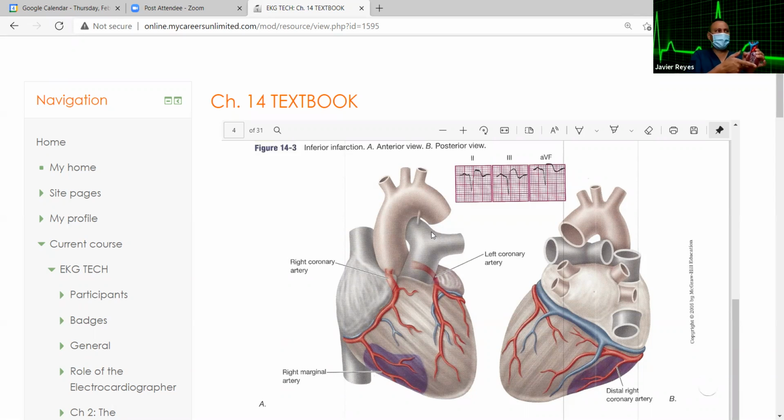And which arteries are affected in this case? Which arteries are affected? It's right there on the picture. The right marginal. The right marginal or the, so it's mainly on the right side, right? In this scenario. So you see the purple means infarct, means there's no oxygen.